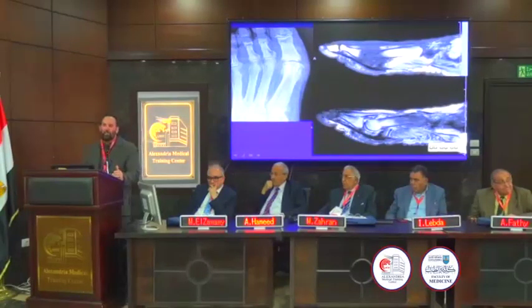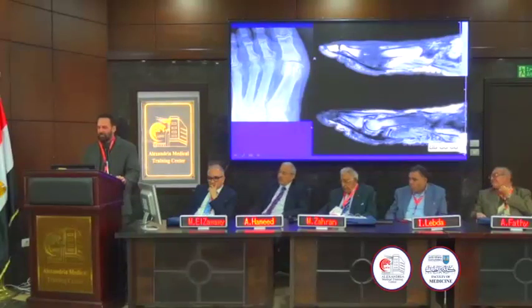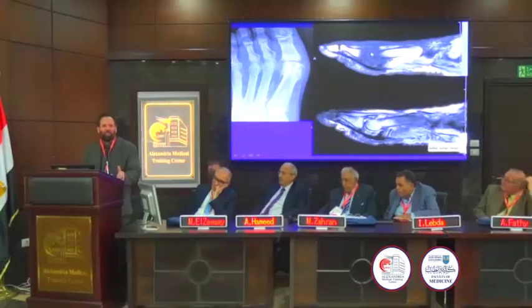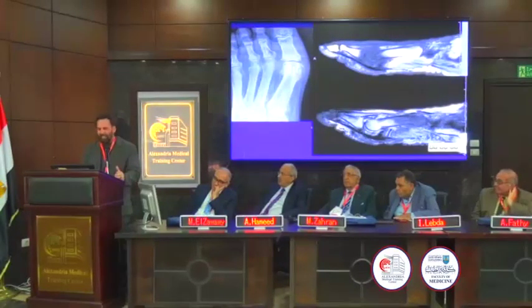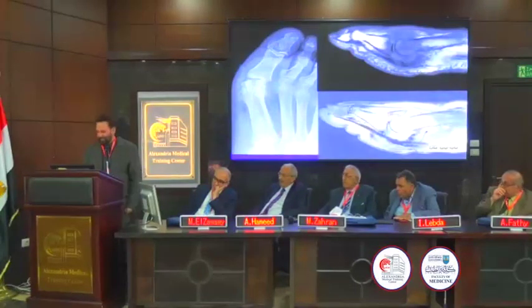Now, how do you distinguish reactive osseous changes from secondary osteomyelitis? And it's a very easy answer. It depends on how obvious the T1 is. The more obvious the T1 is, the more likely it is secondary osteomyelitis. So is this T1 obvious? Yes. And my rule is, if a first-year resident can see it, that's osteomyelitis. If it's anything more subtle than that, it's reactive. And everyone smiles when I say that, because everyone knows what that means. It's pretty standard.